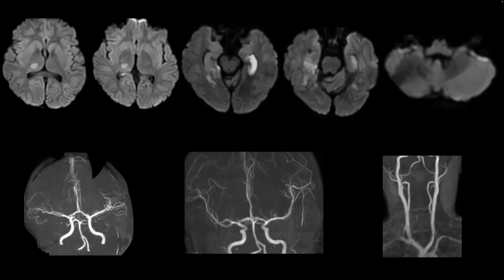So at that time the MRI was done. Yes, sir. So I have a December 22 MRI. Okay. I assume that there was cerebellar injury, because here you can see there are chronic changes in the right cerebellar hemisphere. Is that right? Yes, sir. So the December 21 MRI showed multiple infarcts in the posterior circulation, and along with that there was a vessel wall enhancement seen in the distal part of the M1 portion of the MCA. Left MCA, right MCA was also blocked.